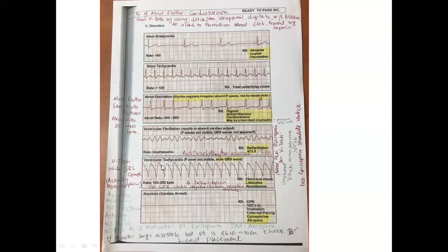Next one is ventricular tachycardia. In case of ventricular tachycardia, the QRS complex is very wide. It is called a monomorphic VTach pattern, right? Monomorphic, wide complex. So if you count by the 6-second formula, we can see the heart rate 100 to 200 beats, and they are produced from the ventricle. It is called ventricular tachycardia. If the patient has ventricular tachycardia, treatment is defibrillation.